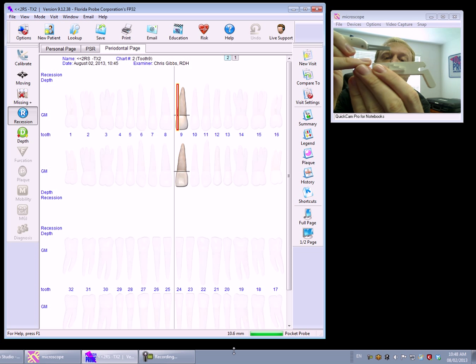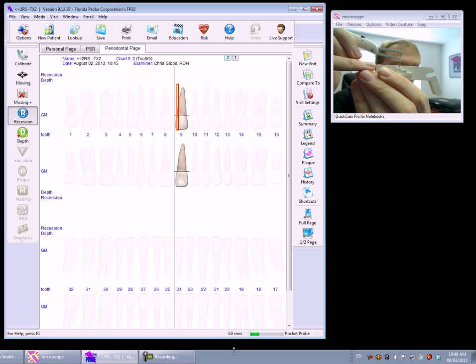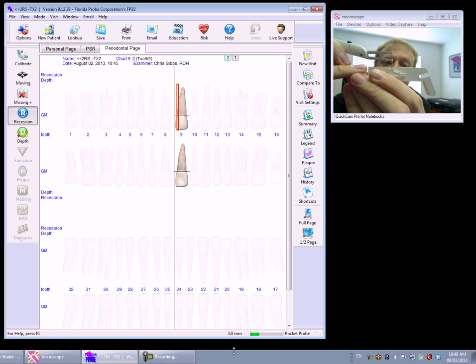And so if you put the tip on the top of the first stair and bring the sleeve down to the top, it measures 3.0. Again, if you're a little bit off angle, you'll notice maybe a 3.2. And so to have it straight up and down is obviously 3.0.